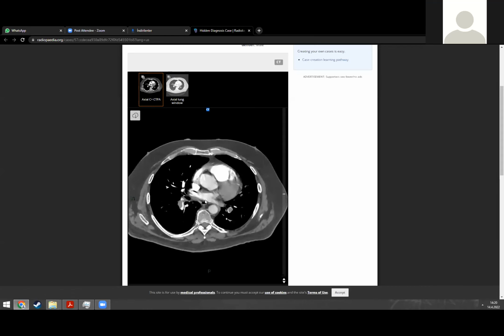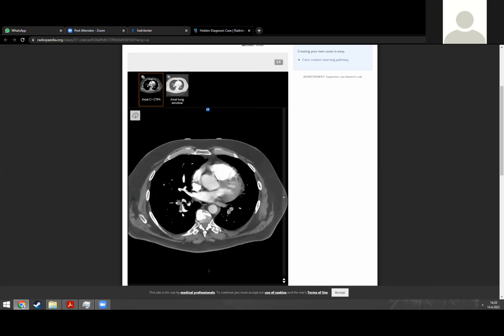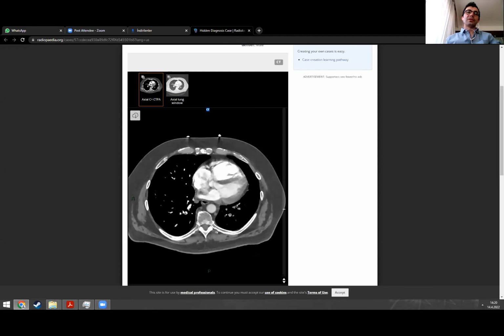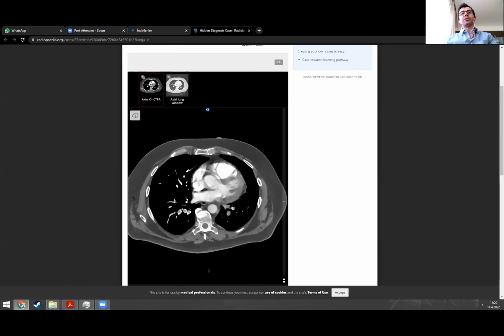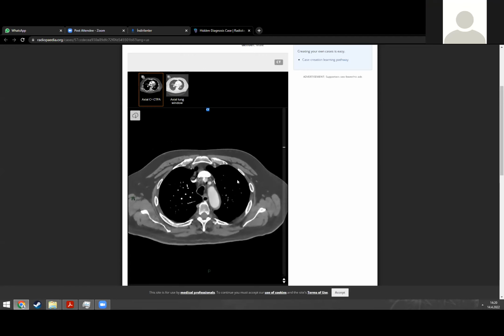Yeah. All right. Okay. So Yunus Emre has detected some stuff, I guess, right? Yes, in this area. Yeah, there are some areas. Yeah, something not right. So we have embolism here. Yeah, we have seen embolism, but we need to check if they actually connect to the pulmonary arteries, because there are pulmonary veins in a thorax CT scan as well, right? So you have to go to the top to see the main pulmonary arteries and follow it all the way down to the parenchyma.